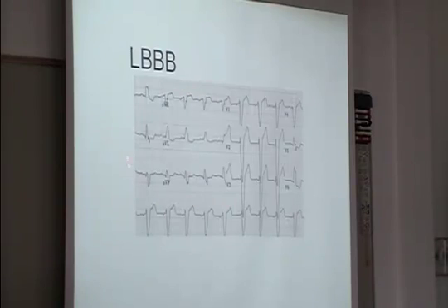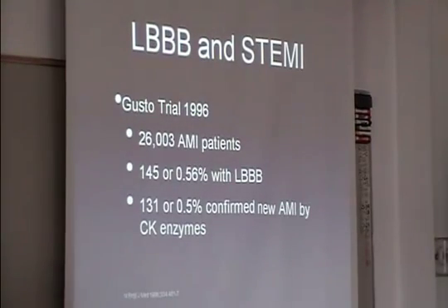The teaching is often you can't diagnose a heart attack through a left bundle branch block. You can see that with this left bundle, you have this ST elevation, and you would be wrong if you called that a heart attack. But there are situations where you can diagnose a heart attack with left bundle.